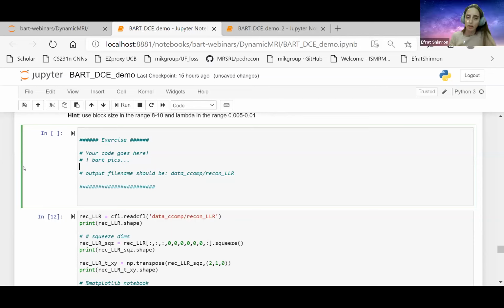Are there any other questions or issues for discussion? Not at the moment. Okay, so I hope that everybody's working on that. It should be just a single line here. And I recommend to use the command line interface.